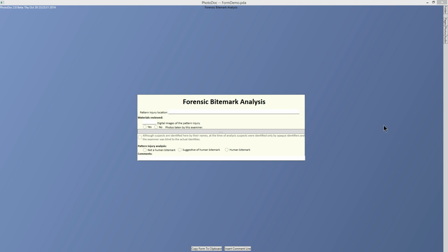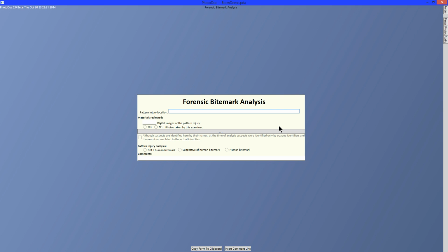Hey guys, this is a short video to demonstrate the implementation of the proposed ABFO Bitemark algorithm that I said I could do during the Las Vegas conference.